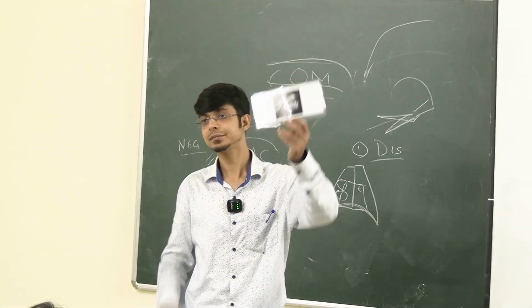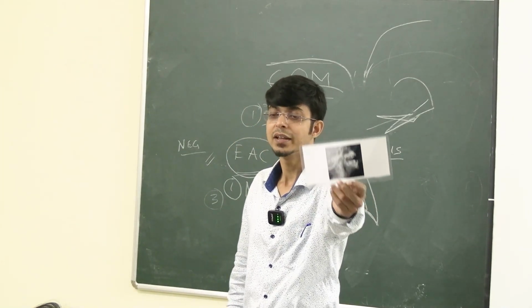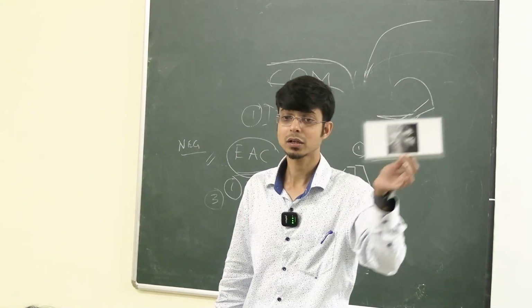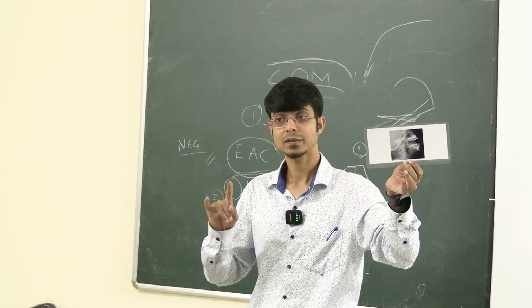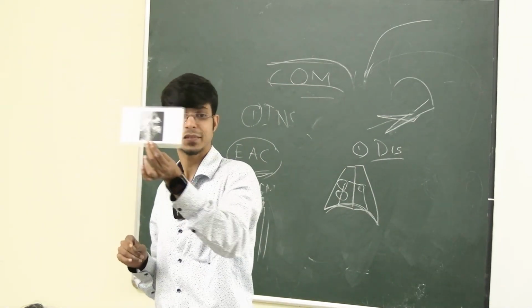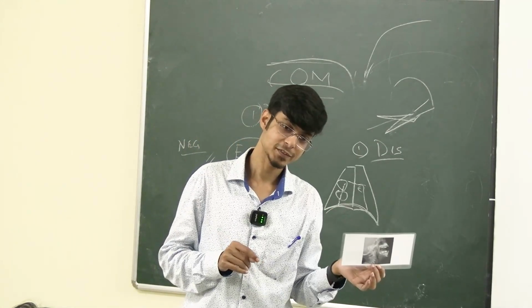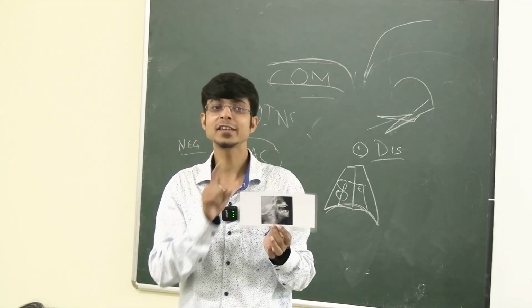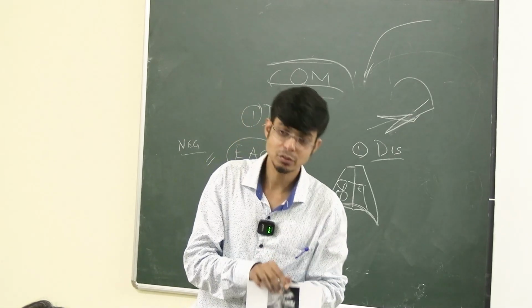So what is this X-ray? X-ray te bolbi na sir adenoid. Ki bollam? This is a diagram of what? Lateral view of nasopharynx. Soft tissue X-ray of the lateral view of nasopharynx, to visualize the adenoids. Okay, then the examiner will ask you, okay, that's good.